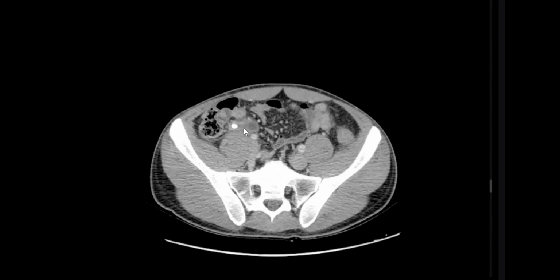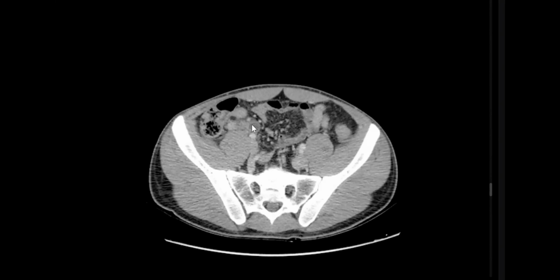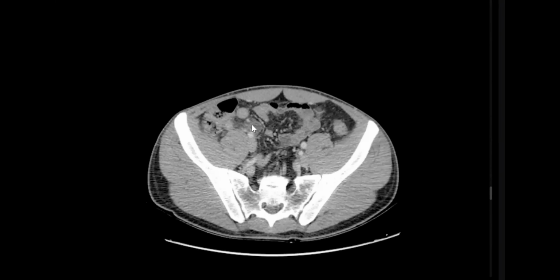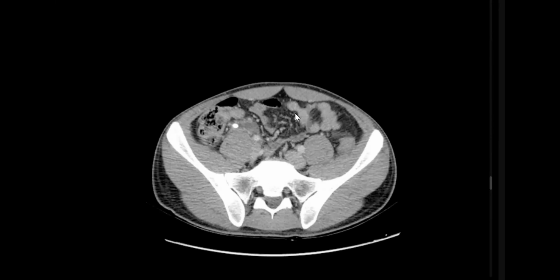Here it's arising from a normal location. Sometimes it's higher, also appendix. What if subhepatic? Yes, subhepatic. What if arising from the small bowel? It's different. It will be Meckel's diverticulum.